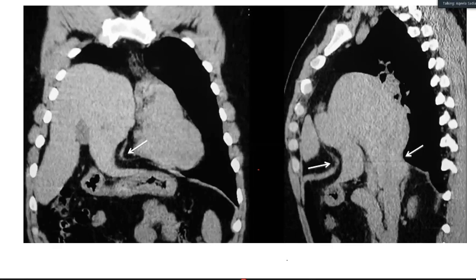So sometimes we all see what is there. There's a diaphragmatic defect, and the patient has a traumatic diaphragmatic hernia. The whole liver has moved up, and what you saw there is because of a rent in the diaphragm with herniation of the liver. And this hernia was surgically repaired. The patient also had urethral stenosis because of a trauma, a traumatic urethral injury. But this one is an incidental finding, all right?